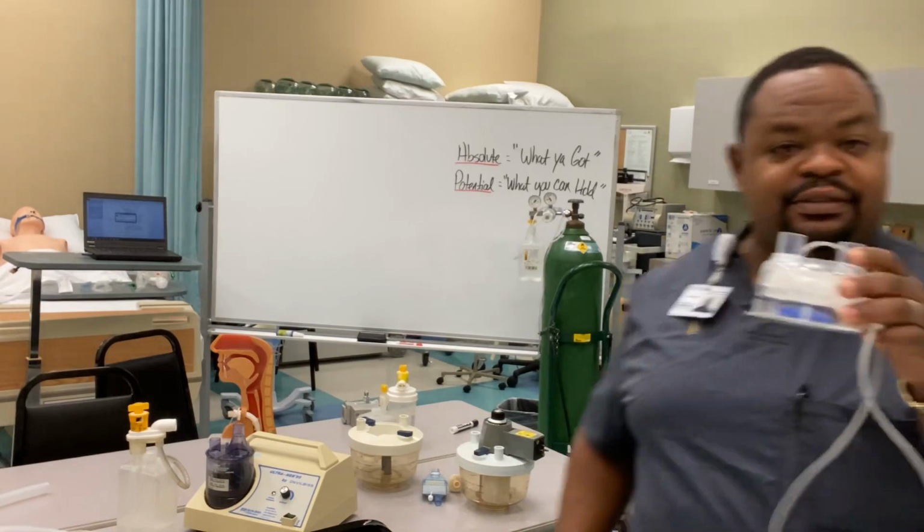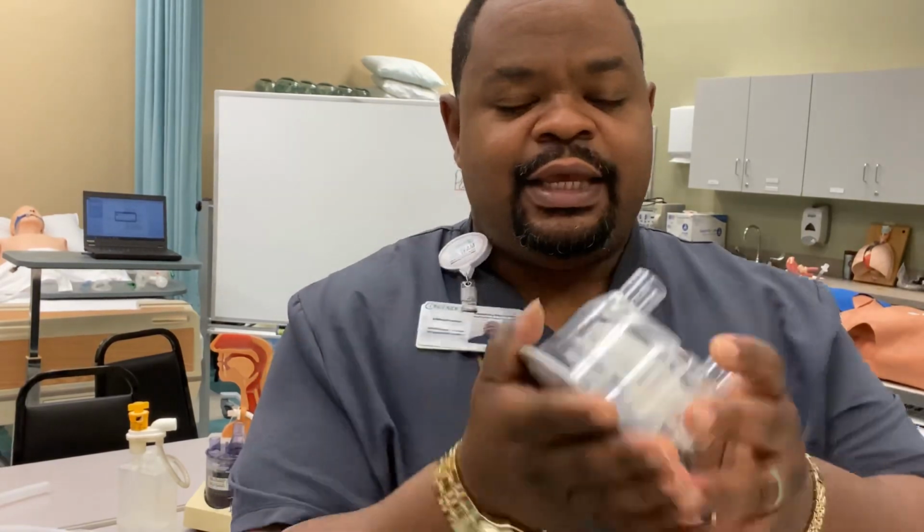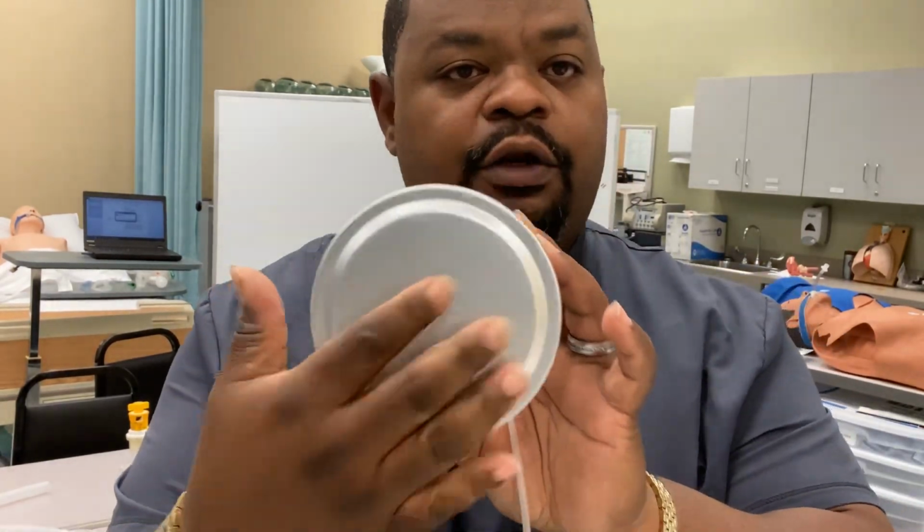Okay, it kind of just sits on top of a heater source. You'd have a heater source. This will slide in it and lock in place, and this metal part here will get hot. The water gets hot, right? And you have your large bore tubing from the machine to the patient.